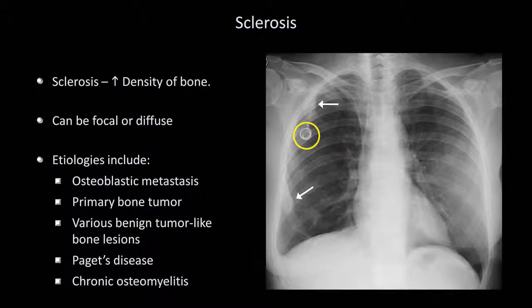And if you look very closely, you'll notice some haze in the mid to lower left lung. The fact that the haze is circular, well circumscribed, and relatively homogeneous makes this probably a breast implant. The combination of a unilateral breast implant with a chemotherapy port means this patient probably has advanced breast cancer, and those two sclerotic bone lesions would be concerning for metastatic disease. This case is a little unusual in that bone mets in breast cancer are usually osteolytic and not osteoblastic, as seen here.